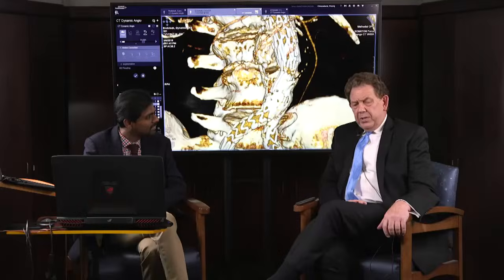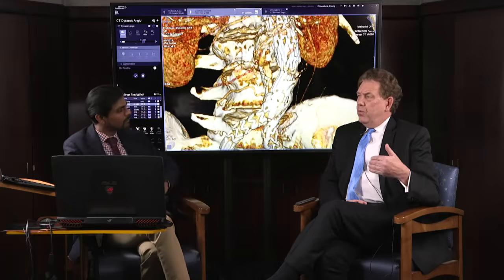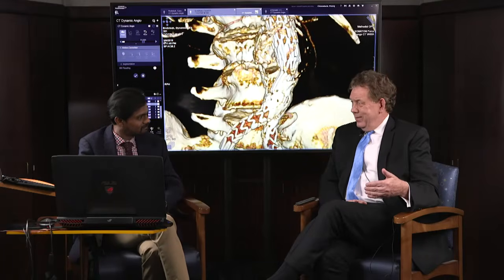So what are the possible ways we could treat, Dr. Lumsden? I guess the principle of this, and this remains to be proven, is that if we treat the inflow artery, we're more likely to be successful than just filling up the endoleak sac, or the endoleak space.